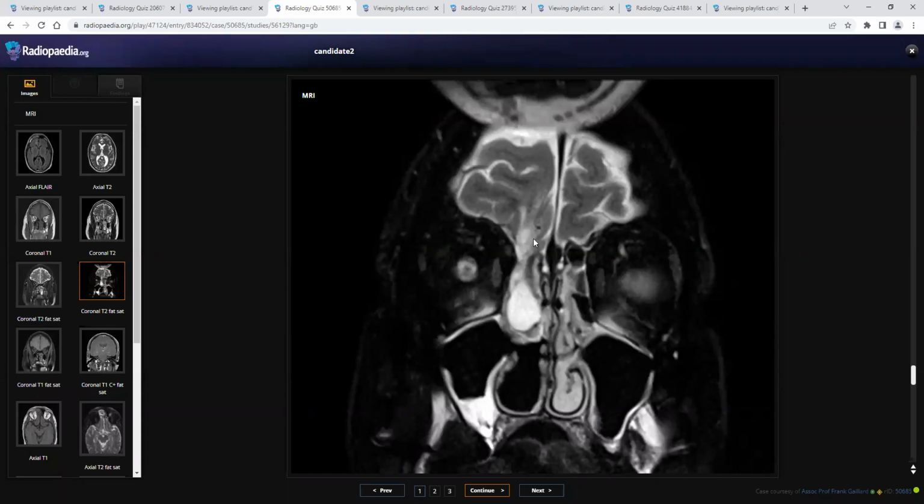So this is, I think, encephalomyelocele, herniation. What do you do? I will refer to the neurosurgical team for further management, surgical repair of this defect. Good.